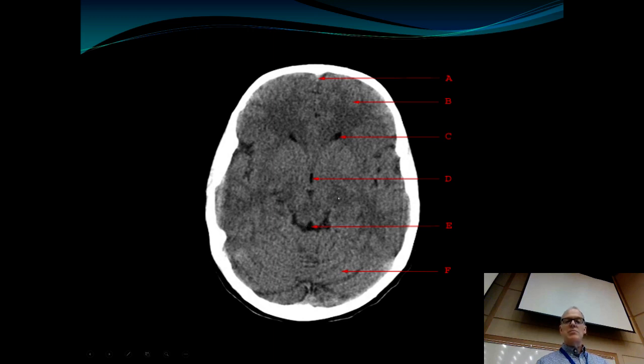So this is actually the midbrain that we're looking at right here. It kind of gets mushed in with everything else. Okay, but this is the midbrain, so probably the red nuclei are here, the cerebral peduncle out in this location, but again, not nearly the detail that we can look at it with an MRI scan.